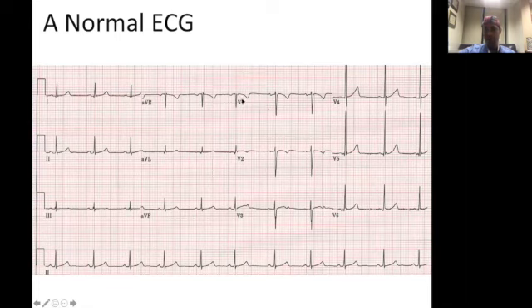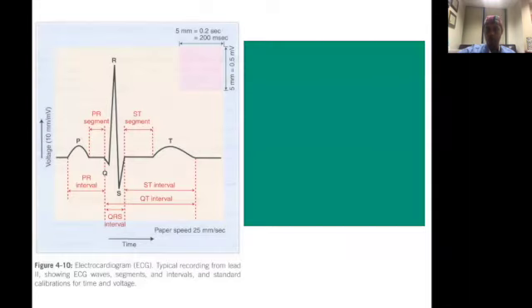And then when you march from V1 through V6, you go from negative deflection, slowly moving to positive deflection of your QRS. So you look at this and you recognize this pattern. And once something looks different than that, you'll be able to pick up abnormal findings. Hopefully, if you watched the video, all I'm doing right now is review.